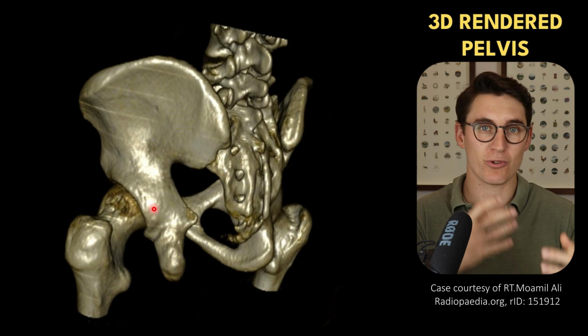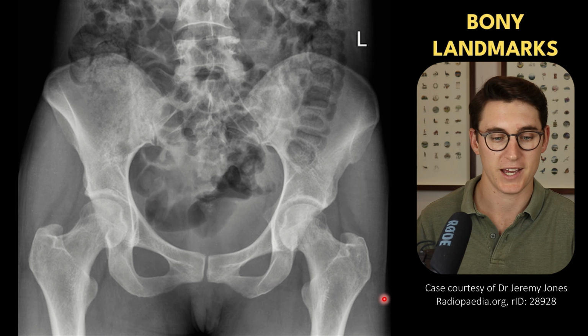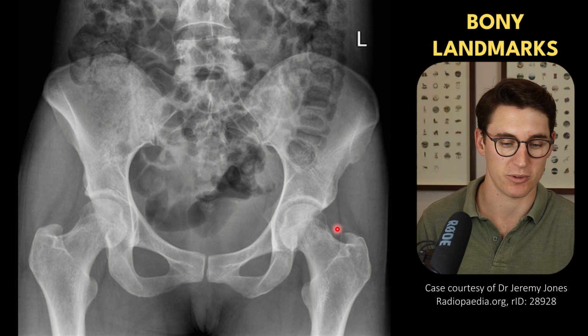So now that we've got a better 3D understanding of the pelvis, let's have a look at our frontal radiograph and start by naming some of the bony landmarks.